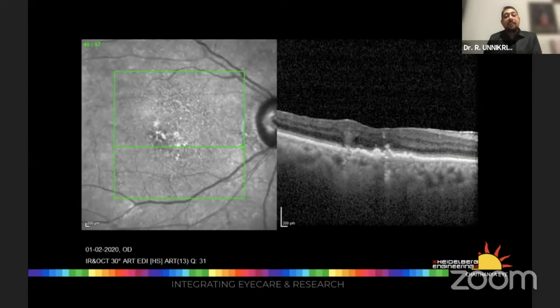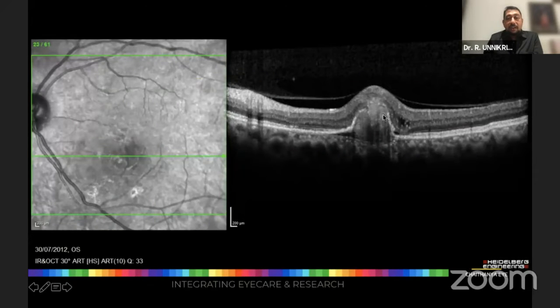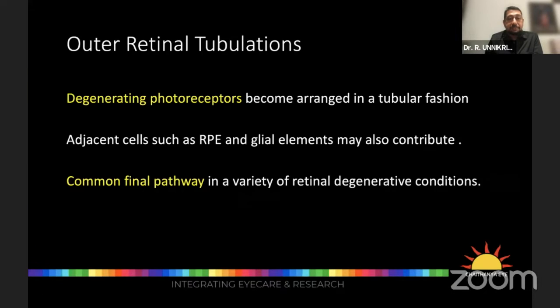Also a significant indicator of atrophic AMD. Here are some pictures in which you can see content coming out of the drusen. Wonderfully, here you can see a large gap in the drusen top with material outside.